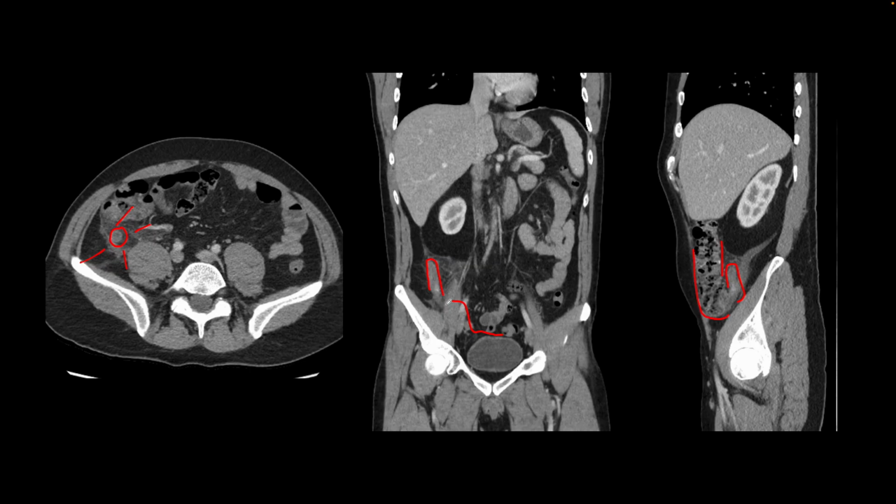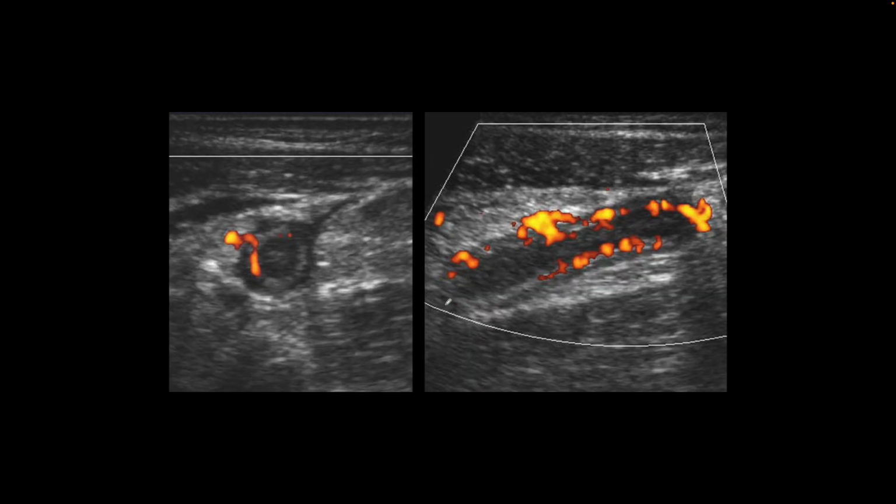Also, if you see a hyperdense appendicolith, it's a good idea to talk about it and measure it. Sometimes after laparoscopic appendectomy, the appendicoliths are dropped in the intraperitoneal compartment and may be the source of future abscess formation. This is a companion image from another patient where acute appendicitis was diagnosed on ultrasound.